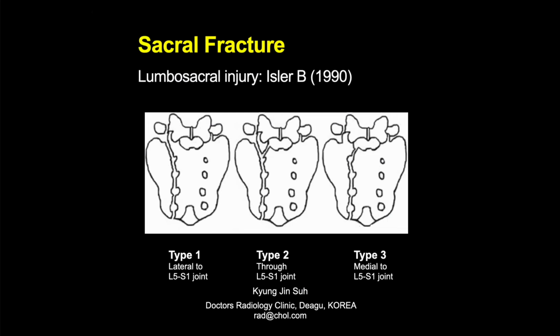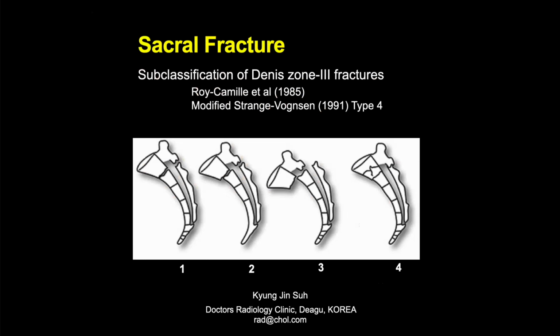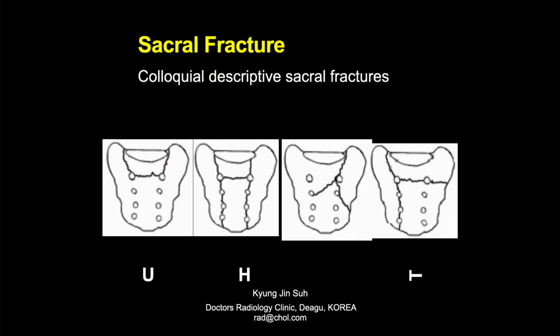Okay, and then let's go out and talk a little bit about sacral fractures. You can certainly get vertical fractures, comminuted fractures. They can extend over into the canal. Some people talk about zones of these. If they're vertical fractures, zones 1, 2, and 3, the vast majority I've seen have been in the 2 category. And then you can describe the extent of the fractures and where they extend outside the bone, the amount of displacement, and if it's affecting any of the nerve roots.